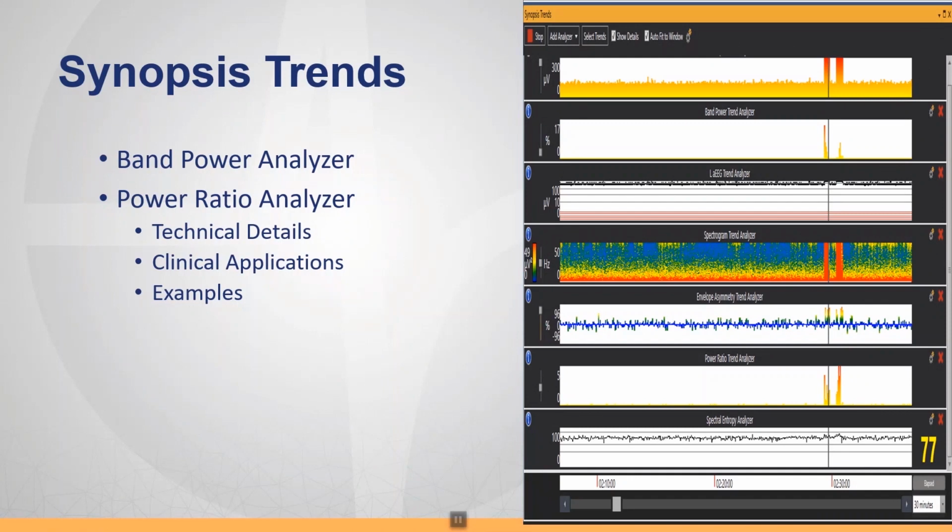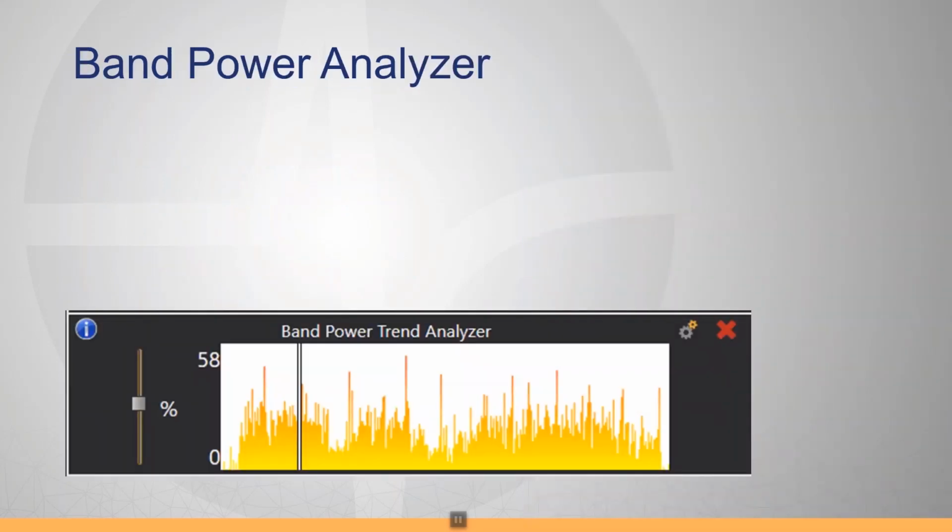Within the Synopsis trends, we're going to talk more specifically about the band power trend analyzer and the power ratio trend analyzer. And we'll talk about the technical details, some clinical applications, and some examples. So we'll start with the band power analyzer.